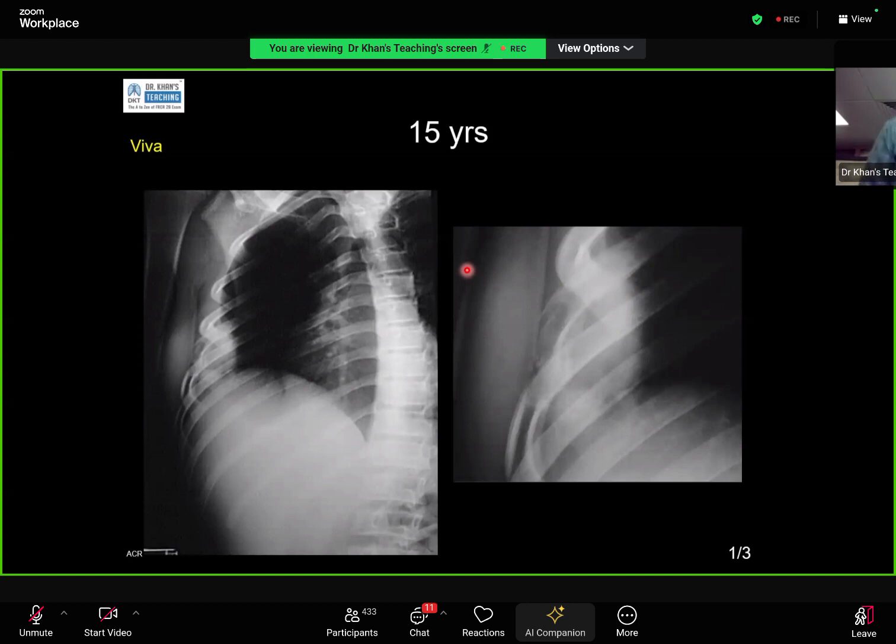Provided frontal and lateral projection views of the right side of the chest, showing an ill-defined lytic lesion involving the anterior aspect of the rib.